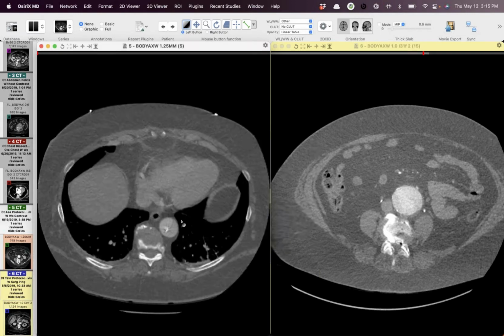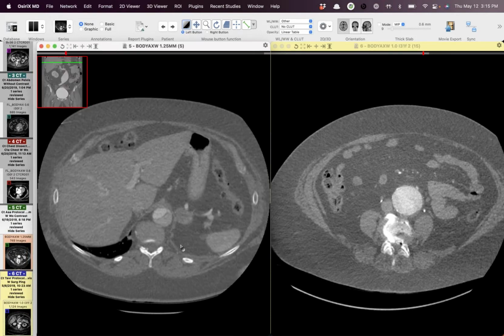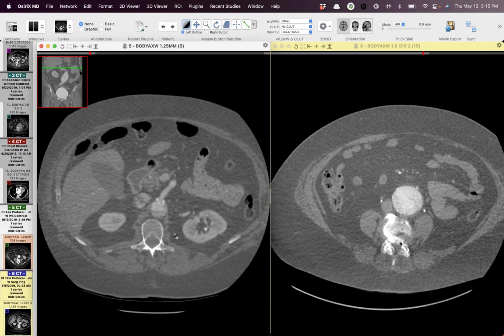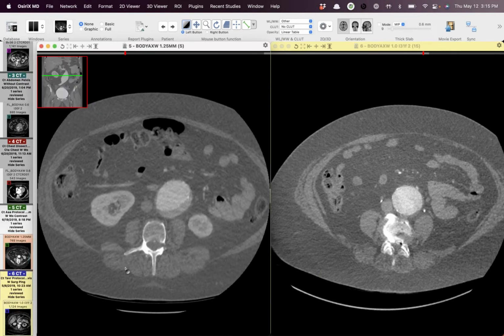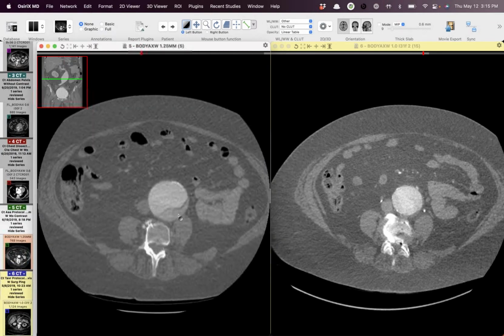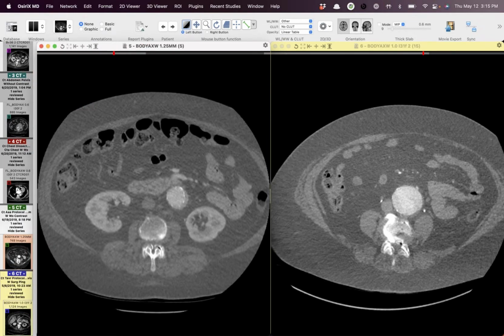They underwent a TAVR and then had abdominal pain. So you can see that at this point, they only did an abdomen and pelvis, but this dissection was new from the pre-CT. This is a couple months, I think, or less, or just over a month. So this was almost assuredly an iatrogenic dissection of the abdominal aorta from the catheter intervention for the TAVR.